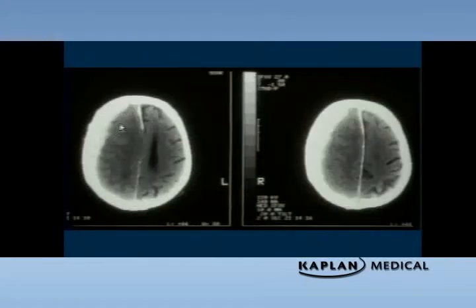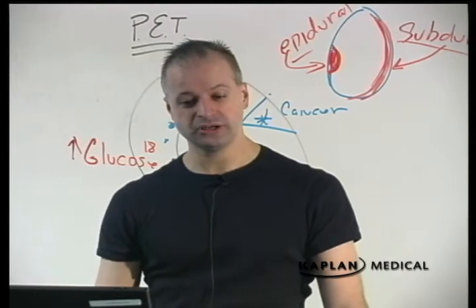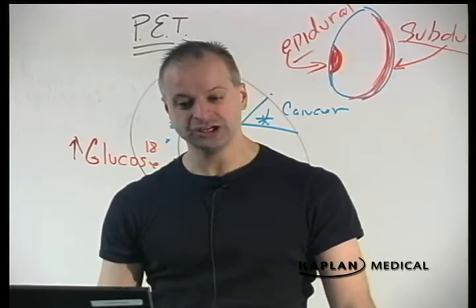Subdural, going around the brain, conforming to the shape of the brain. Now, you'll see here that the ventricle has been compressed, obscured, obliterated, eliminated, gone. Here, this ventricle is open. This is the sign of pressure and mass effect. This is a person who's trying to herniate their brain. This person needs intubation, hyperventilation, mannitol, and surgical evacuation, to drain this out before they herniate.